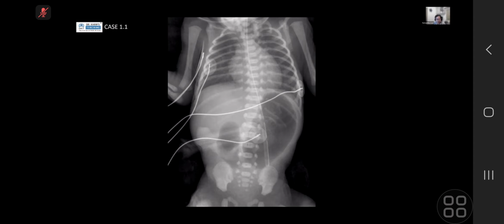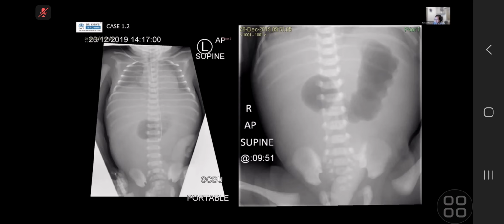Okay, I'll tell you the feedback later. Next one. So you've got two different cases here. Actually, no, same case, different times.